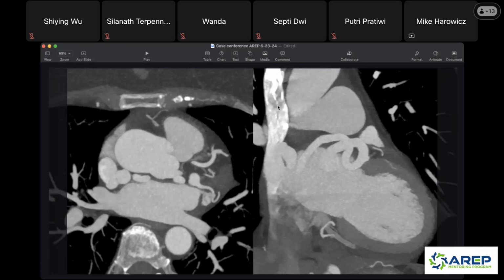So, coronal image, big vein dumping into your right atrium. IVC. Very close. So IVC is going to be lower down, right? So this is your SVC because it's higher up, but very close. Your vena cava, right? And that is not where your coronary should be going, right? Your coronary overlies your heart normally and supplies that myocardium. So you can actually see it's dumping into that, and it's dumping into the right atrium.